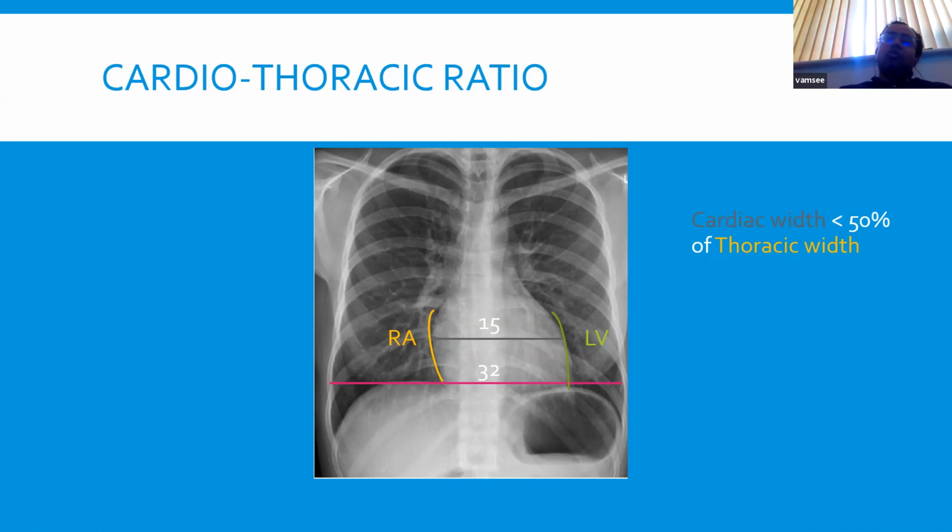One other thing I just wanted to add here is that, yes, you've got the 4 chambers of the heart, you've got the 2 upper atria, and then you've got the ventricles. But when you look at it on a chest film, the orientation of the anatomy is actually not that straightforward. So you've got the right atrium, which forms the heart border on the right here. Now, on the left, while it's roughly symmetrical on the chest, it's not the left atrium. The left atrium, the way the heart's arranged, is actually the posteriormost chamber, and you don't actually visualize it that well on a chest X-ray usually.